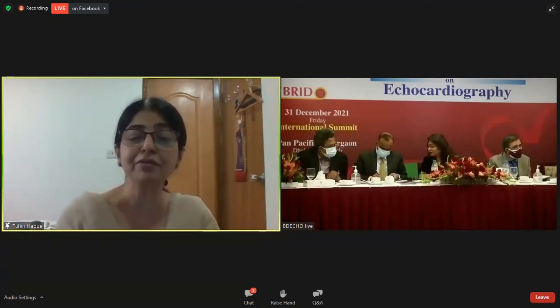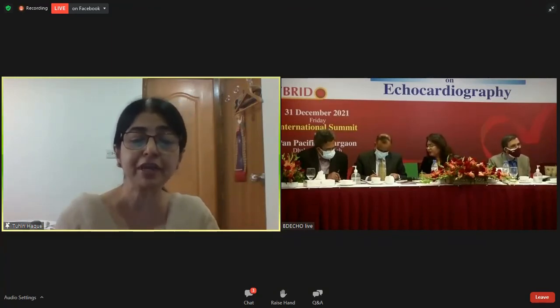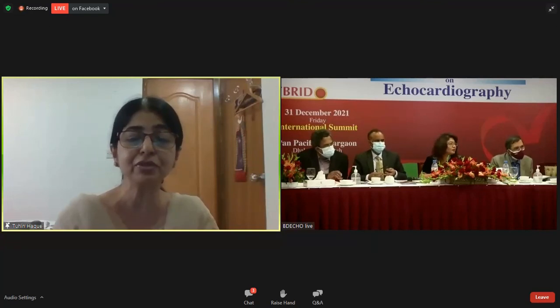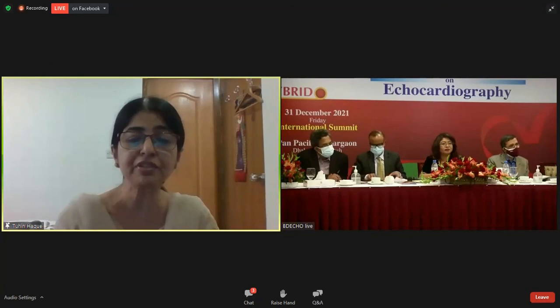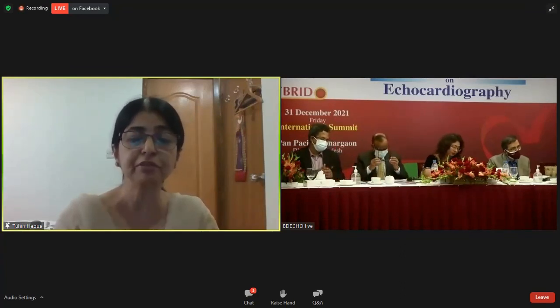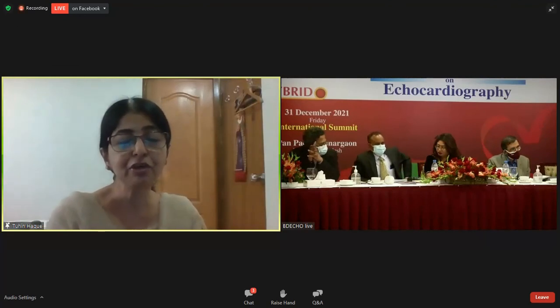So please look at all aspects, starting from the color turbulence, when it starts, where it starts. Echo is not something we should do in a hurry. Look very carefully and meticulously, so you will not miss cases. And in valve morphology, leaflet thickening is not the only cause of MS. Keep in mind that the leaflet may be normal but the gradient high. So even in adults, look whether there is parachute mitral valve, whether there is supravalvular membrane. Please look carefully. All the presenters presented their cases very nicely, and congratulations to all.